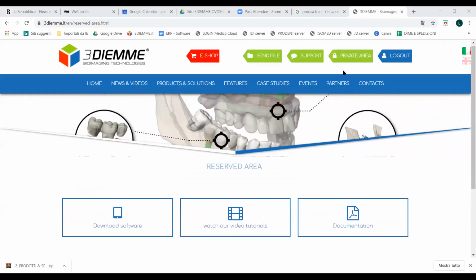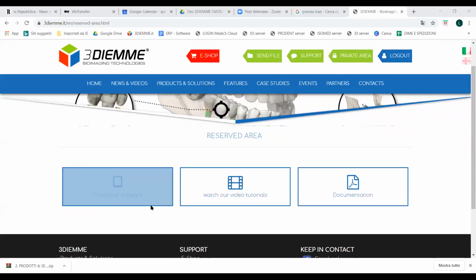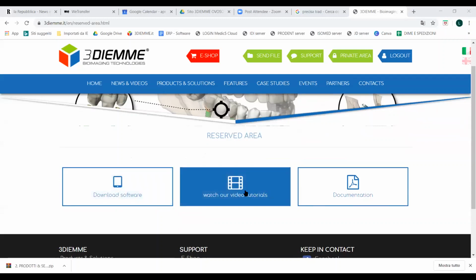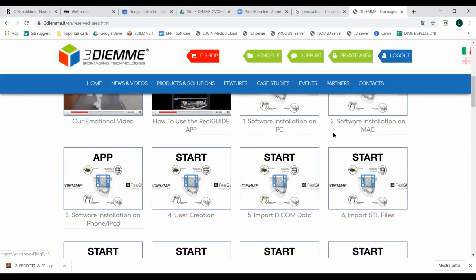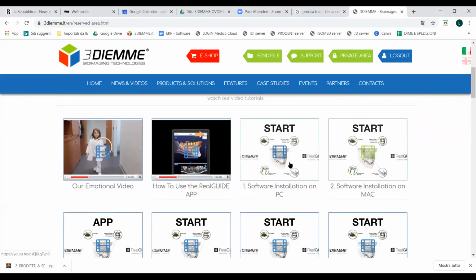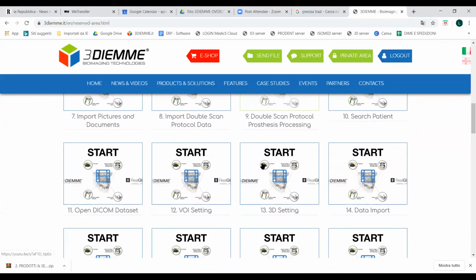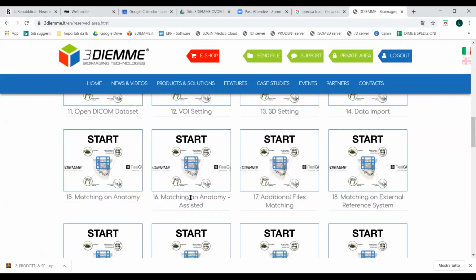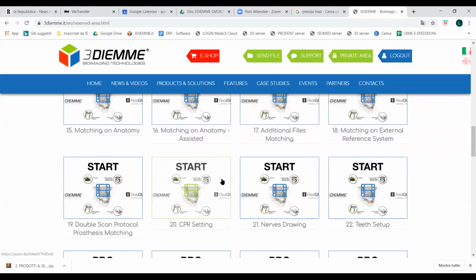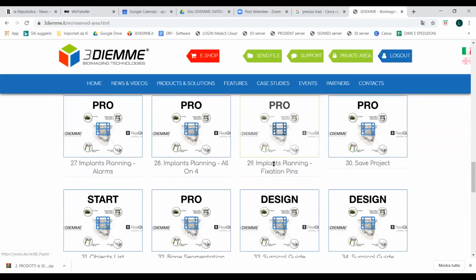Here, as you can see, as Alice said, in the private area you can find the link for downloading the software or our video tutorials. As you can see, there are a lot of video tutorials about our different modules. Start, open DICOM dataset, matching on anatomy is assisted, CPR settings, nerve drawing, implant planning.